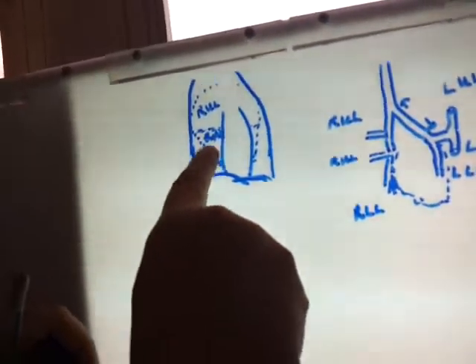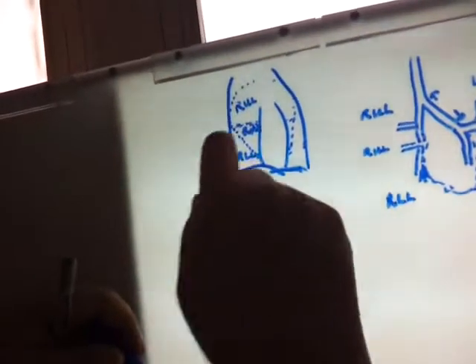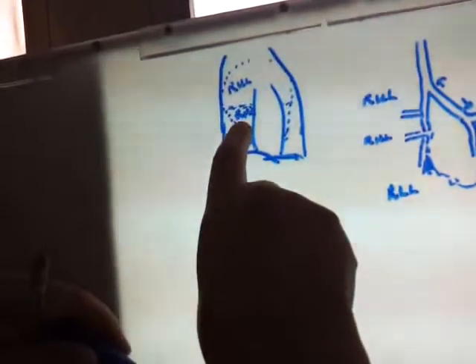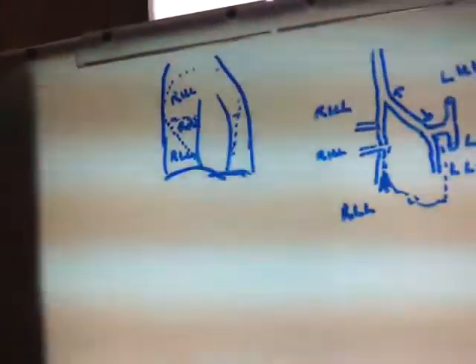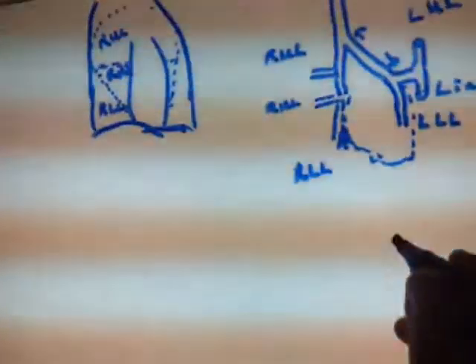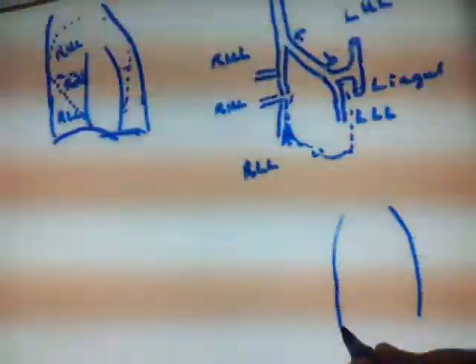If the bronchial breathing is mainly anterior, this is right middle lobe pneumonia. As in this patient, we hear it in the right side mainly anteriorly, but in the left side we hear the bronchial breathing mainly posteriorly. It is the lower lobe on the left and right middle lobe on the right.